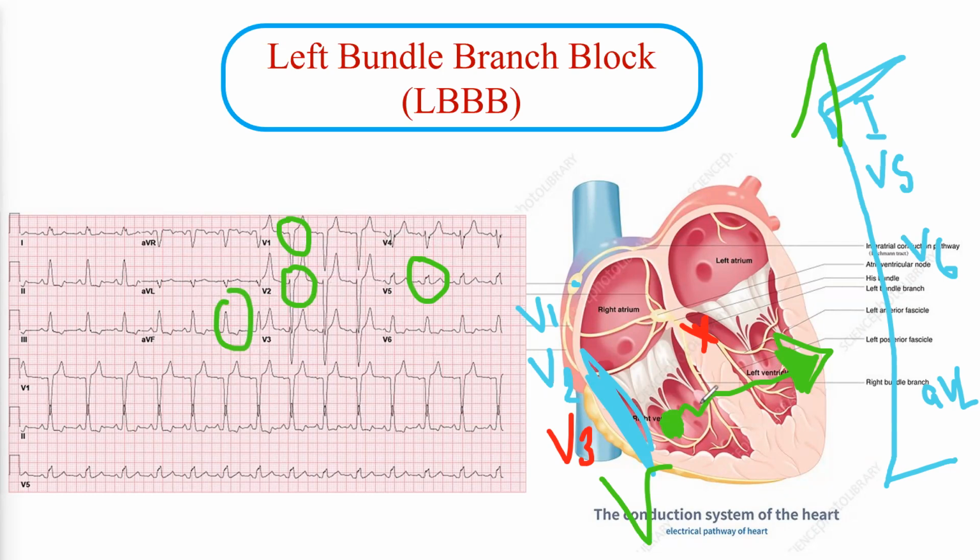Moreover, because the electricity is now going from the right ventricle toward the left ventricle, there is a huge axis shift. If you look at the EKG, you will find left axis deviation as well.